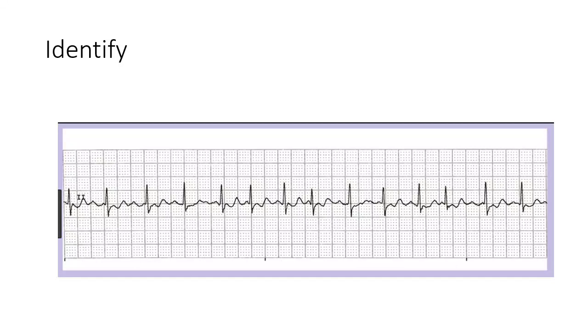I will tell you that's your T wave right there. Here's your T wave. There's your T wave. That's your T wave. So it has a rate of 150, it looks like. Oh no, 130. So we automatically know what about it. It's a tachycardia. So now think through the hard drive in your brain of all the different types of tachycardia that we have covered.